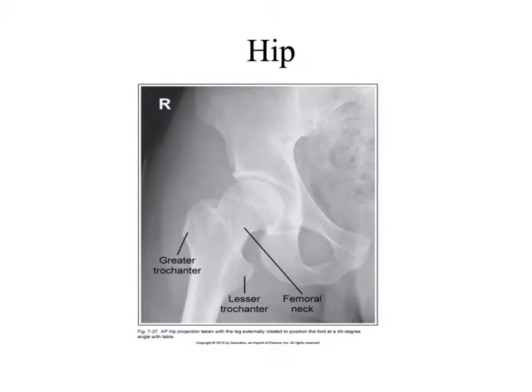All right, let's talk about the hip. In terms of just what we're looking at on this image, let's talk a little bit about what we see. There are no wrong answers here, all right? But it's centered, yes. We have it centered on the hip. So we know that that's probably what they want us to be paying attention to.